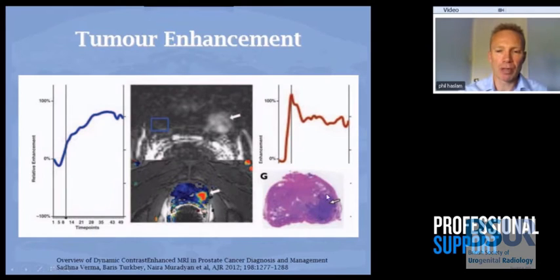And on the block section for the prostate gland, that's the area of the tumour. So really quite a beautiful correlation between enhancement and tumour.